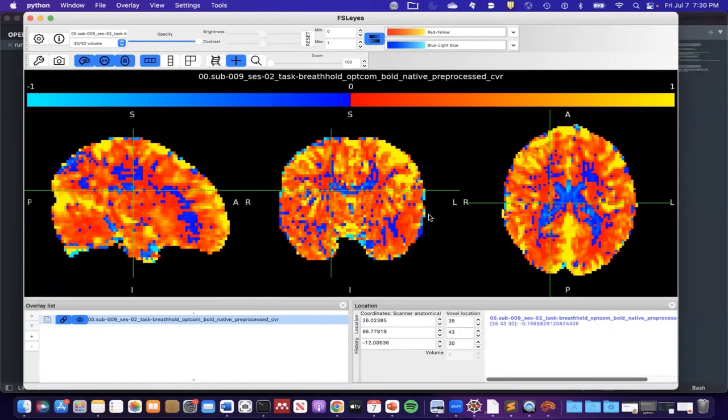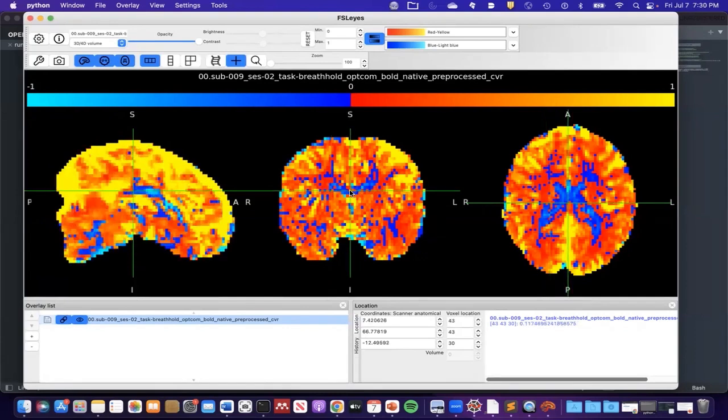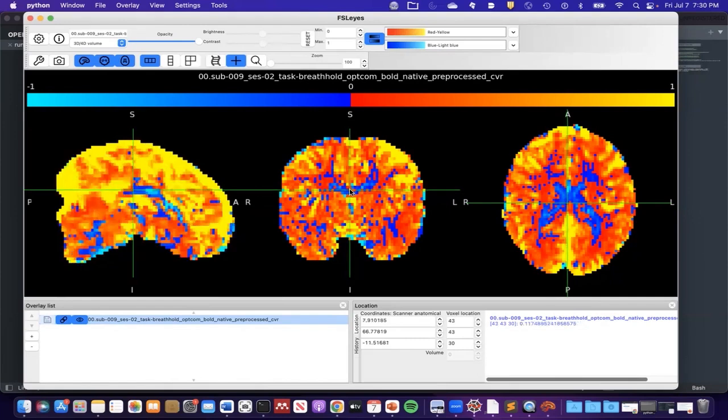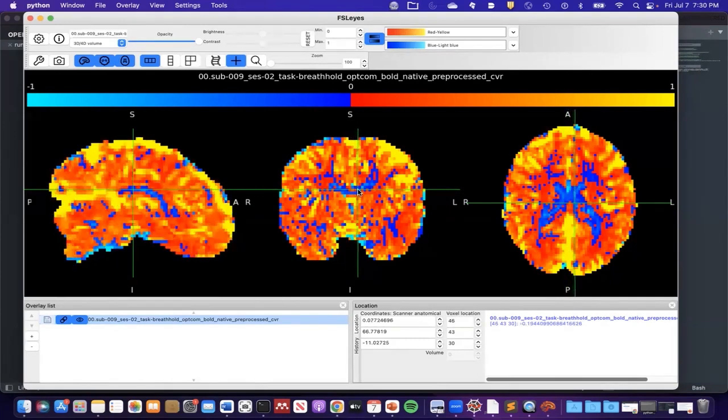The color scale that I normally use, and that some people I collaborate with use, is a Viridis scale, but inverted. These color bars can be imported to FSL, and I will include those files in the GitHub repository. For the positive color bar, we actually want to use the negative range of Viridis, and then the opposite for the negative. And we want to select this option so that we have a negative to positive range.